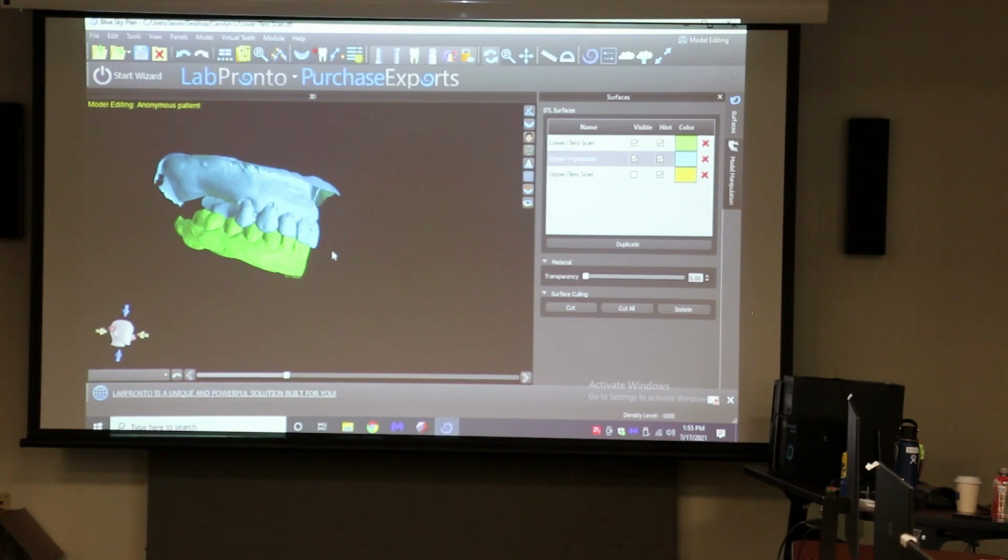It's kind of hard to learn what buttons to click. Yeah. As long as it's real close, right? It's not like this has to be pretty. Correct. This isn't needing to be as accurate.